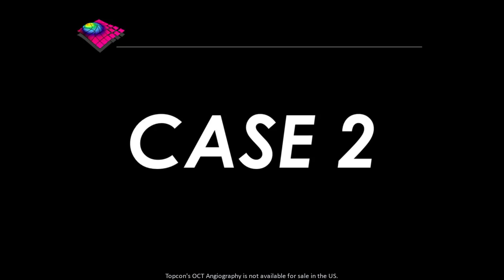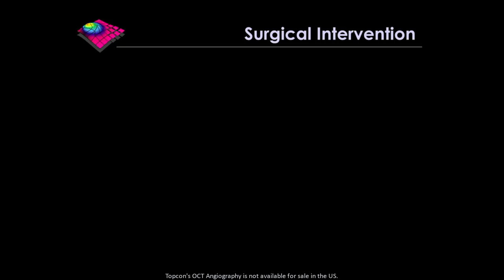The other way is we've diagnosed proliferative diabetic retinopathy, and you could say, well, that's not that difficult to do. We've diagnosed it, and now we want to have an objective way to monitor the response to treatment. But in this case, I'm going to show you something a little bit different, which is how we can use wide field OCT and OCTA as a way to help guide surgical intervention in these cases. And so let me show you an example.